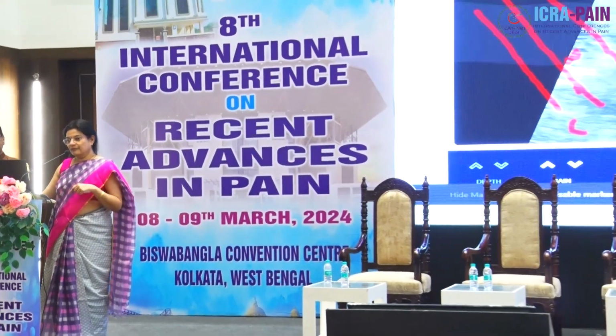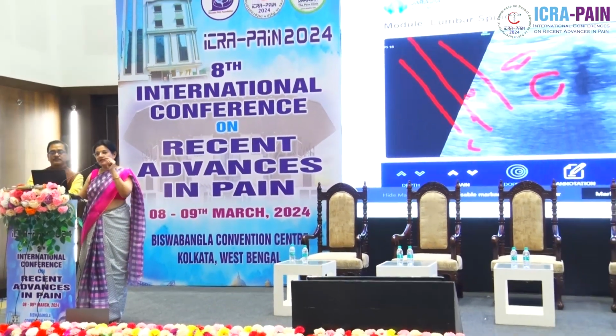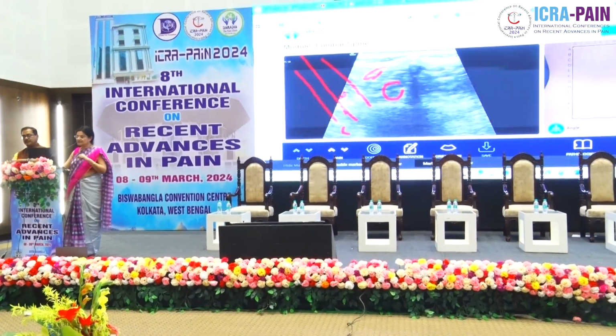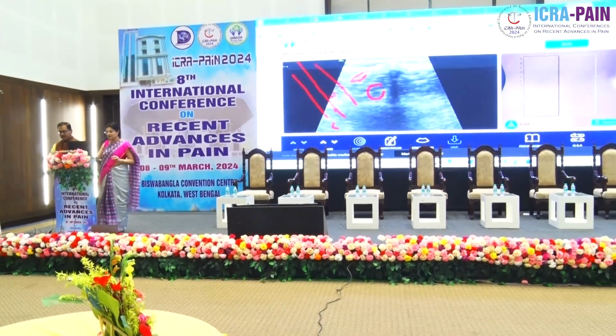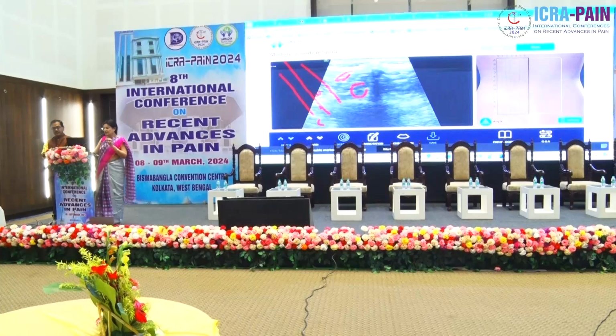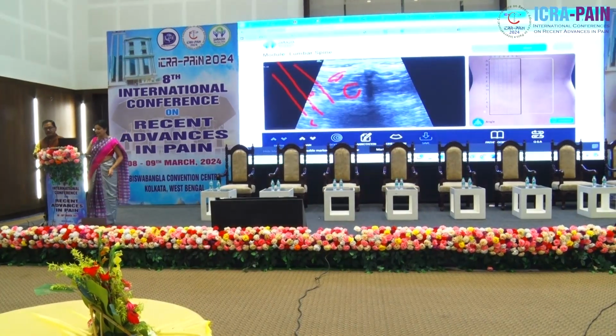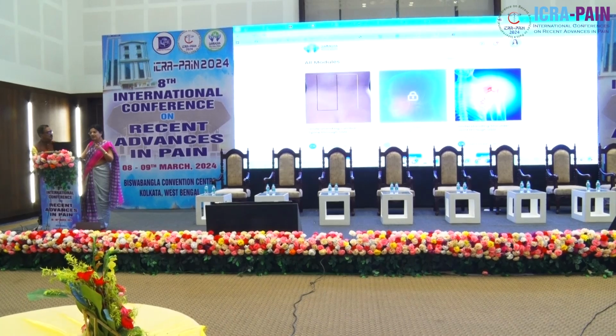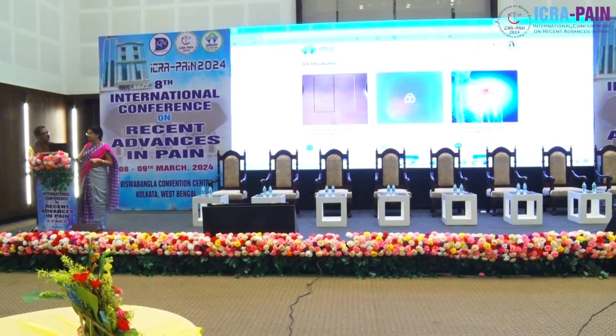We are also planning to put in conditions. So whatever Dr. Das is explaining, the important notes, if we click on this, those important notes will come as a pop-up here. Different people will have different notes that they are saving.